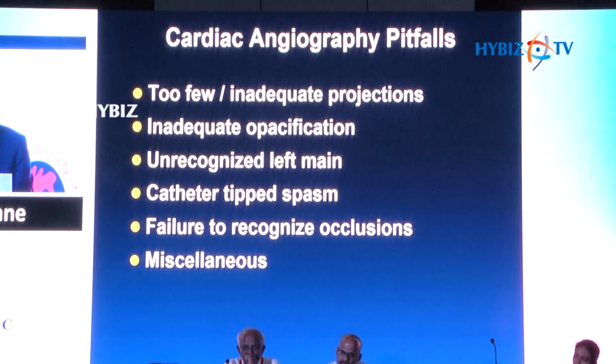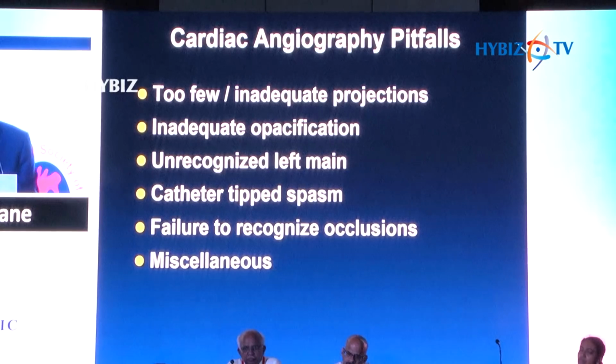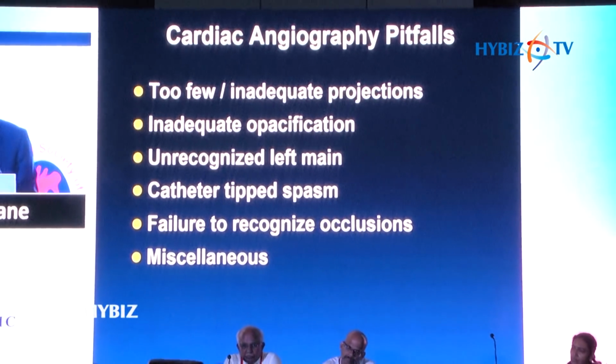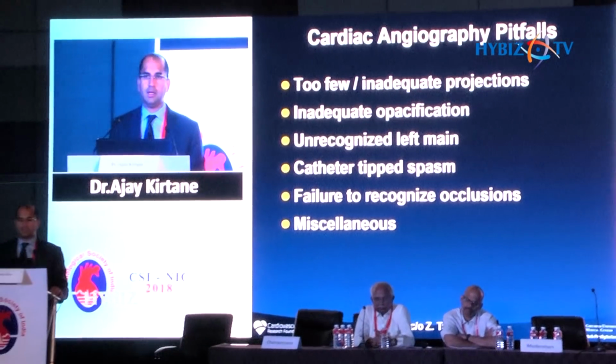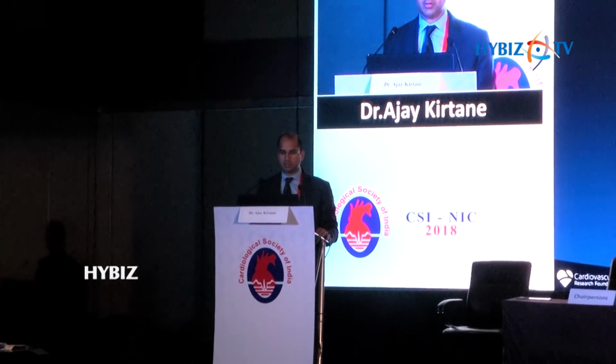Now, basic pitfalls of angiography, I mentioned some of them earlier. Others include inadequate projections, inadequate opacification, unrecognized left main disease, as I mentioned before, and then other miscellaneous things. So here are just some examples.